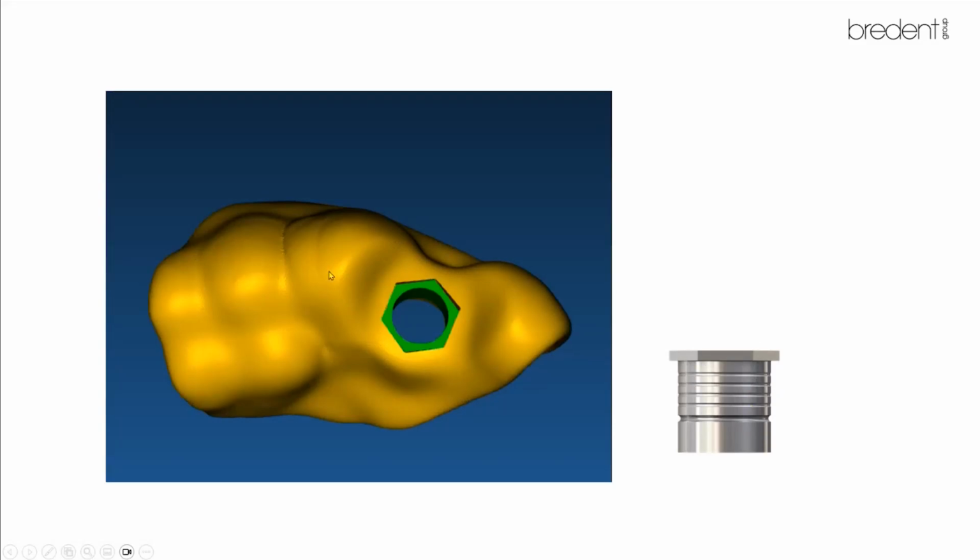Then we cure it in the curing box together, so the sleeve is tightly held in the surgical guide and is not disturbed during the surgical procedure. This is how we follow, but many also use cement to place it, but it's your choice.